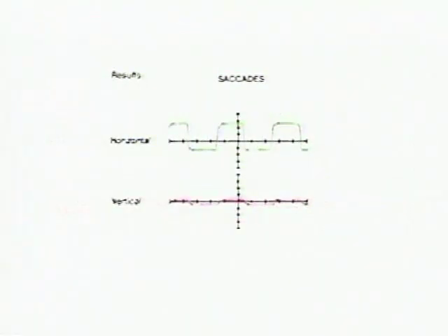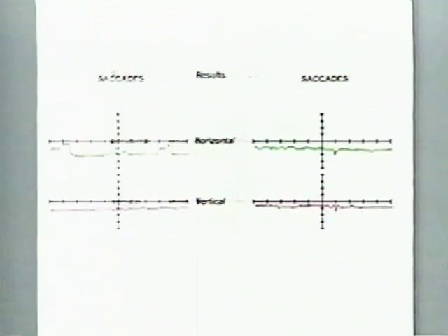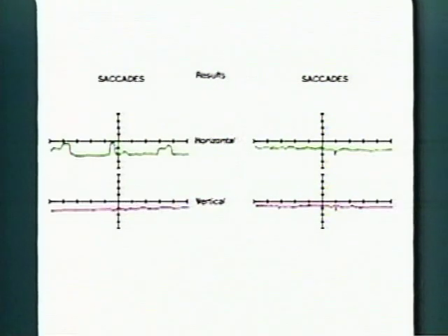The next example is that of an undershoot, where the patient was not able to keep up with the moving large target, and therefore the tracing demonstrates that the patient was unable to focus their attention properly. The last two examples show an absolute lack of any saccadic motion whatsoever, which is completely abnormal and which represents a more profound central nervous system lesion.